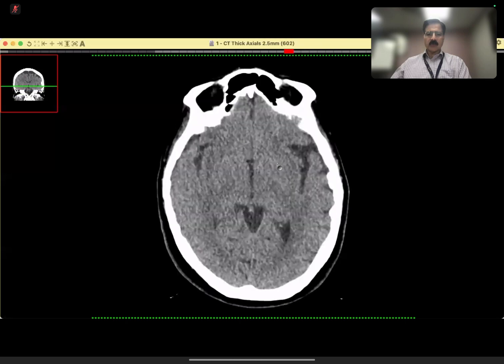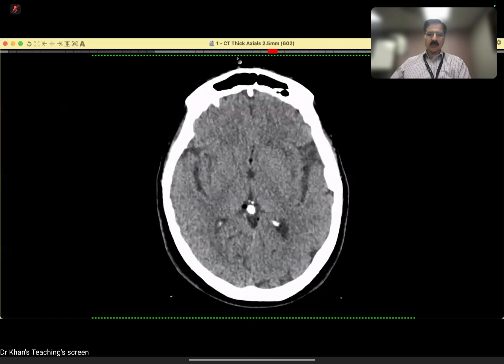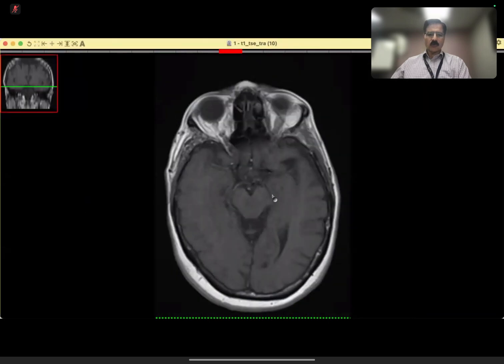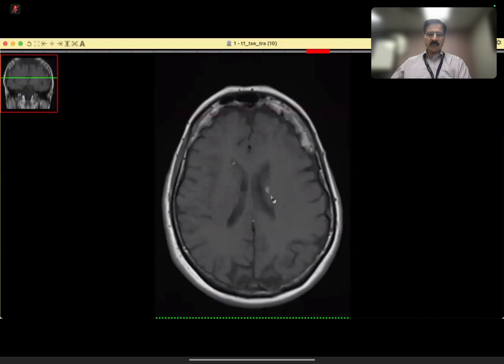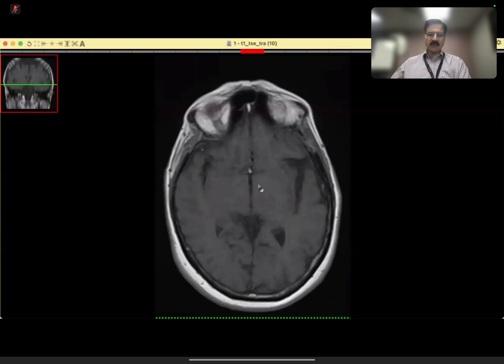Now it's fine to ask for MR, which is what it is, that on MR, on T1 weighted sequence, you can see, first of all, on axial, the same thing actually. Now this droplet has slightly changed location. This one is there, and then in the suprasellar region. But where is the dermoid?